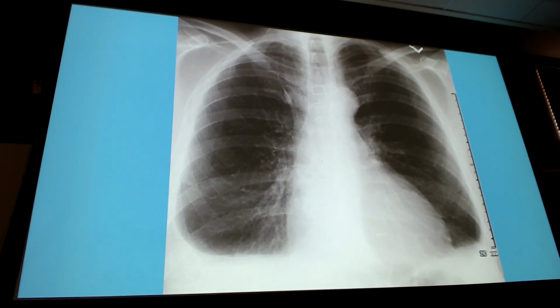So we're good. We know that cardiomegaly is not necessarily from poor inspiration. Okay? Could there be enough pleural fluid to kind of push the heart up a little bit? There could be, but I'm not worried about that too much. If I have my ribs and I don't have any other cause for the large heart, then we're going to call it cardiomegaly.